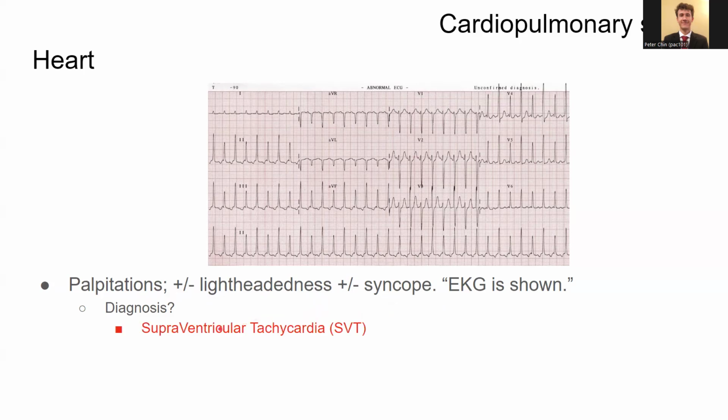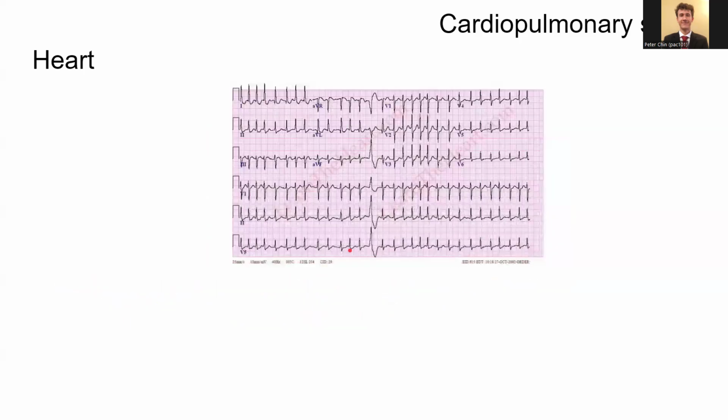This is supraventricular tachycardia, or SVT. Okay, right. We will move on to this EKG.